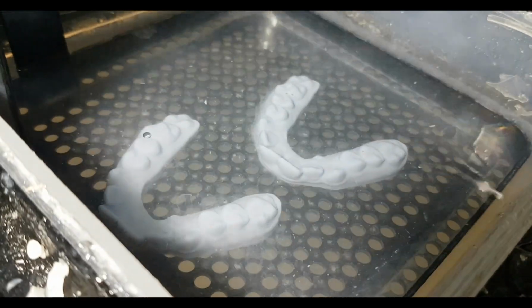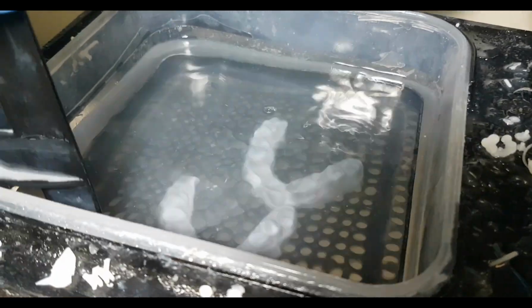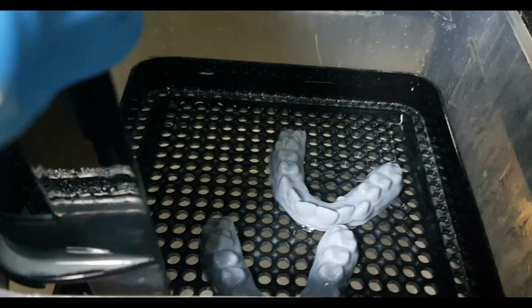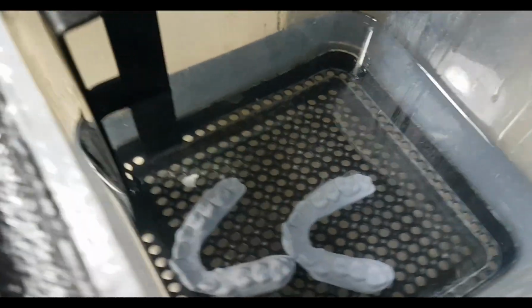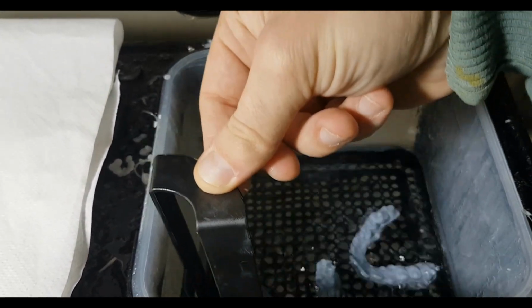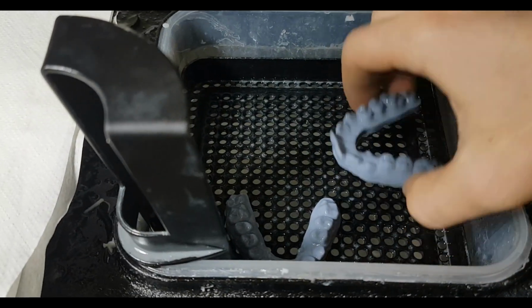First, you introduce it into a slightly dirty isopropyl alcohol, the one that you use for the first wash. And after about 10 minutes, I bring it out, I give it a little shake to remove all the extra resin, and I put it into a quite clean isopropyl alcohol. In this one you can actually see there's barely any debris. The result is after 10 minutes, you can also wash it a little bit and bring it out and all the details come out.